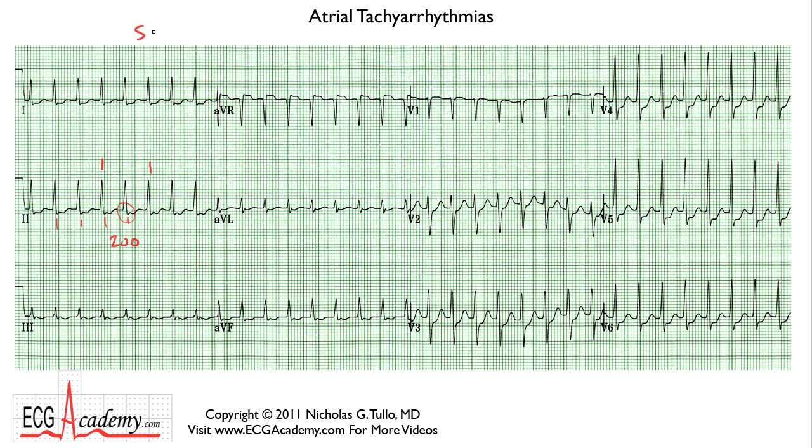So you would call this supraventricular tachycardia. If the patient described that it started suddenly and he came to the emergency room and got an injection of something like adenosine or diltiazem and it breaks suddenly, then you would call this paroxysmal supraventricular tachycardia. But again, that's a diagnosis that's kind of based on the behavior of the arrhythmia. It's more of a clinical diagnosis. The electrocardiographic name for this would be SVT. You don't see those discrete P waves in front of each QRS complex, so atrial tachycardia would be less appropriate under these circumstances. It's getting a little complicated, but watch these videos over and over again and listen to the rest of the videos in this section, and it'll make sense to you.